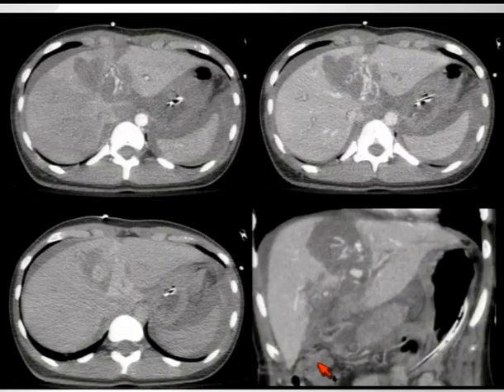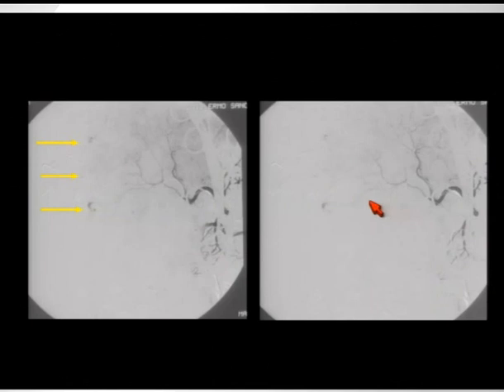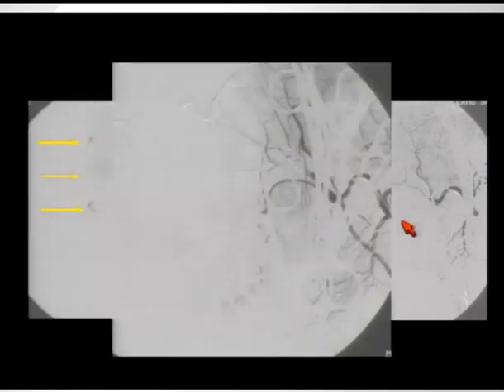On the other hand, you can have fairly significant contrast extravasation, as you have here. Overall, for the most part, the liver capsule is intact here, probably a little defect up top maybe, but something like this in a patient who's reasonably stable could be managed primarily by embolization, as happened in this case. You can see evidence of active extravasation at embolization. The patient was embolized with the coils here, and the post-procedural imaging shows that the extravasation has resolved.